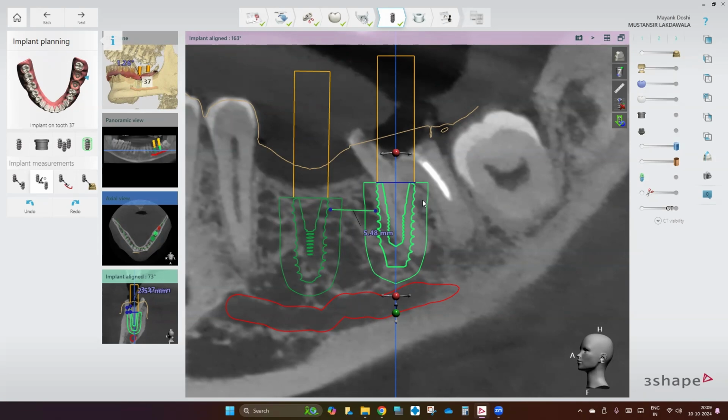The implant goes, flattens out completely through the guide. After removing the guide, you should not touch the implant. The only thing they can do is decide whether they want to put a healing abutment or a cover screw. That's their choice, but they will not take a ratchet and tighten the implant or loosen the implant, nothing, because then that implant can move, which you don't want it to. Is this part clear to everyone?